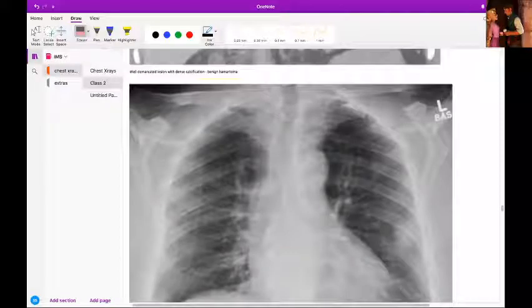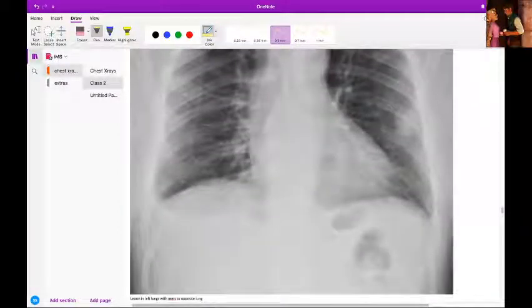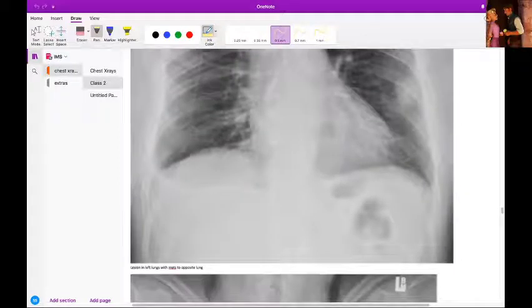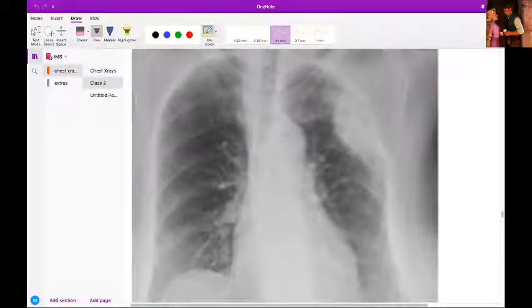I think maybe there's something happening over here also. Anyways, you can end up missing the right one, so that can happen. Okay, now this one. What do you guys see here?